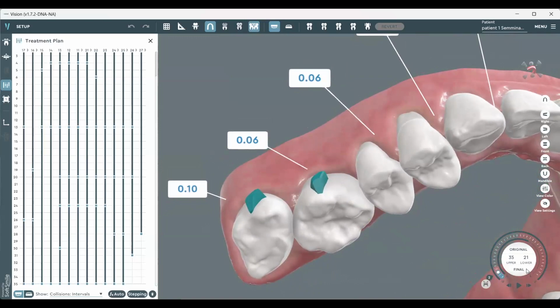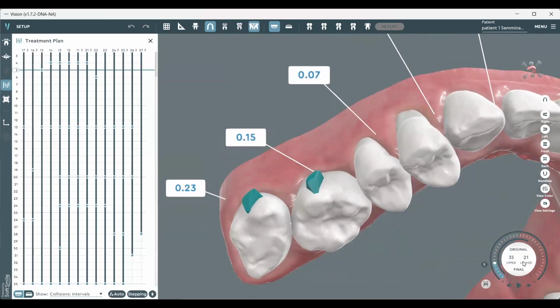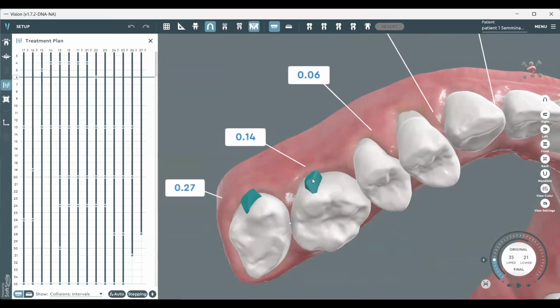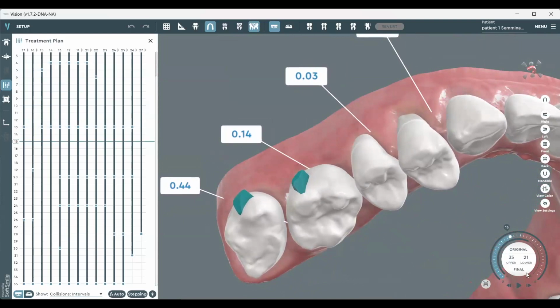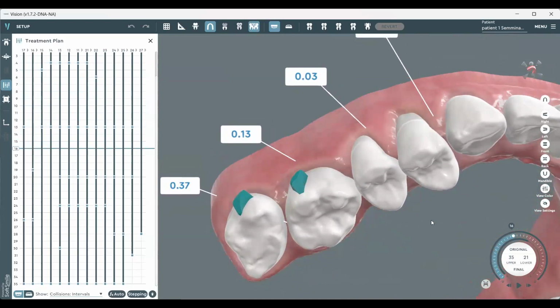So I started doing the rotation and passing the force here to make the distal out movement. You can see this is the active surface at this moment of the attachment, and making the mesial part go out. Also, the aligner is going to create pressure, but also here is going to create the forces.